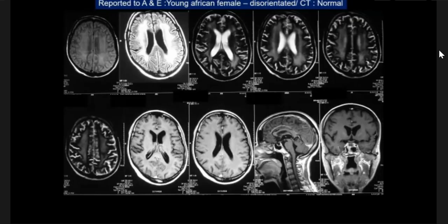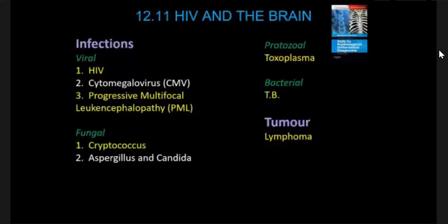It does not fit PRES, and also does not fit demyelination, or maybe a severe form of demyelination or severe form of vasculitis, but I'm more inclined towards white matter diseases like PML and HIV leukoencephalopathy. Excellent. Okay, well done. Now, candidate 3, thank you very much. Well done. And candidate 4, raise your hand, but I'll do a bit of teaching on this case.